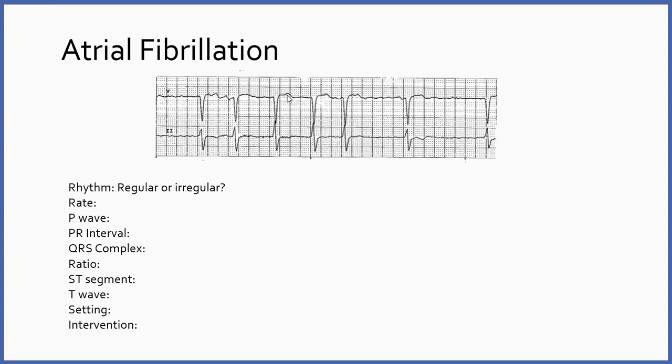So find the T wave that looks the best. I can see the T wave here. I might even see a little ST segment elevation here. It's really hard to tell, but I can see my T wave here, okay? So I can look at that, and I can do a QT interval with it. So I can measure from here to here.